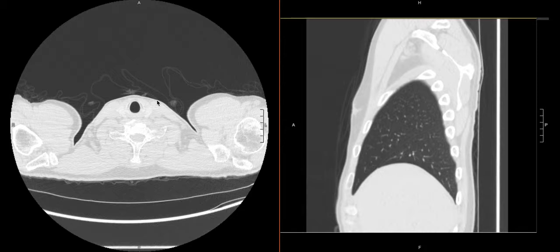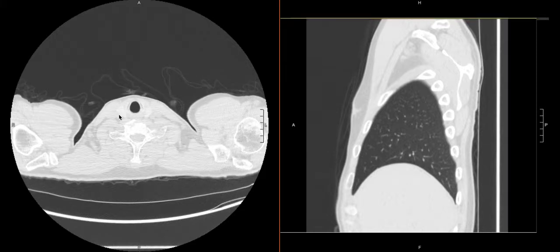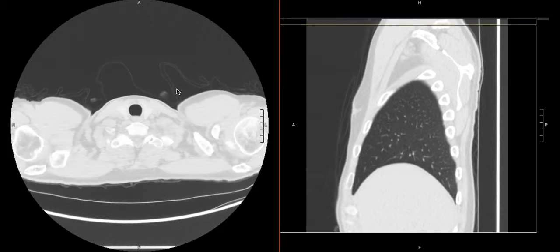different opinions about how thin of a slice you should use to look at the lungs. Bottom line is the thinner slices you use, the more things you will pick up. Oftentimes what you're picking up may be small and inconsequential, but for the purposes of this video, we're going to use the thinnest slices that we have available. These are the 0.625 millimeter slices. We have it on the lung window here.